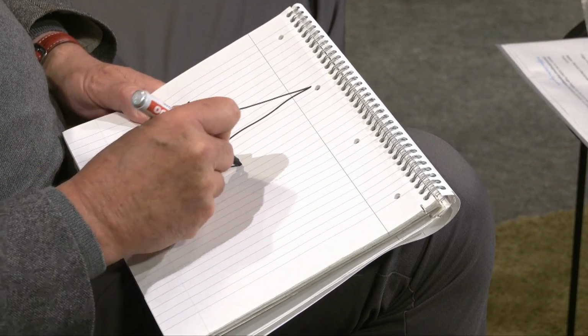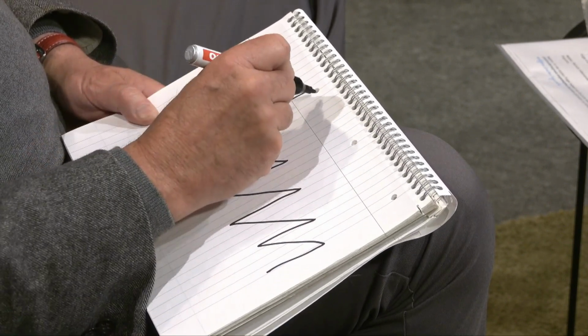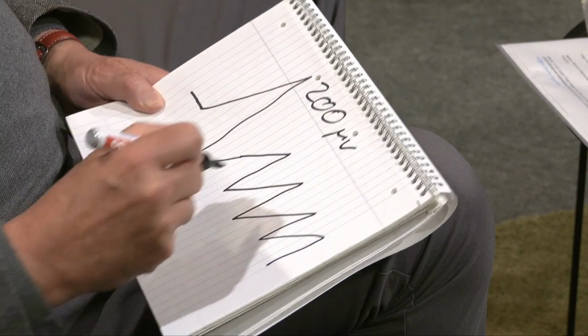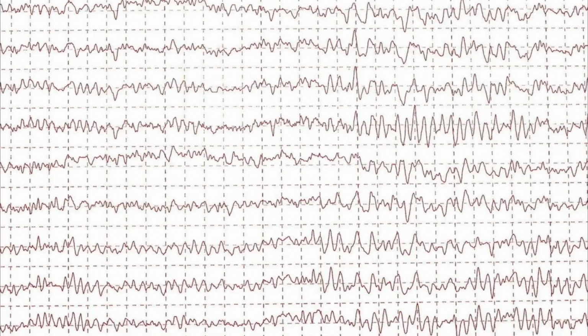And then when it gets faster, the spikes are smaller, but the frequency is higher, just as I said, like with alternating current. Although they are actually current spikes that move up and down on a horizontal line running from left to right over time, we refer to them as waves and patterns. Here we look at the frequency of these spikes and their deflection height, which is called the amplitude.